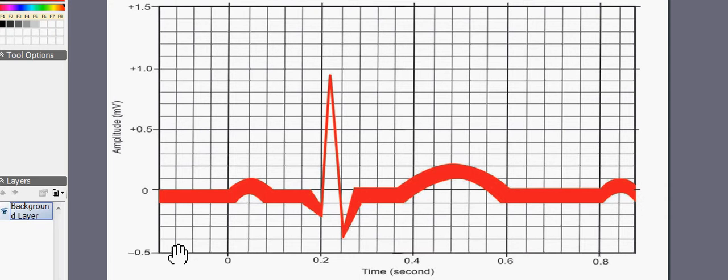And now we will focus on the ECG. Generally, in the graph of the ECG, along the x-axis time is denoted, and along the y-axis we have the amplitude in millivolts. The time is taken in seconds, and along the x-axis, for one single box, we have 0.04 seconds. So one small tiny box refers to 0.04 seconds.